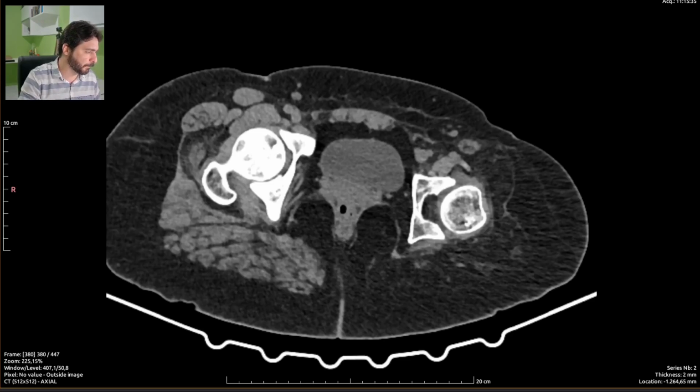And this is it. I'm just going to state on the summary that there are no signs of kidney stones nor hydronephrosis, because it's easier for the doctor just to read this and be done with the report.